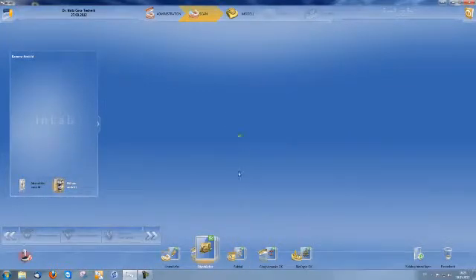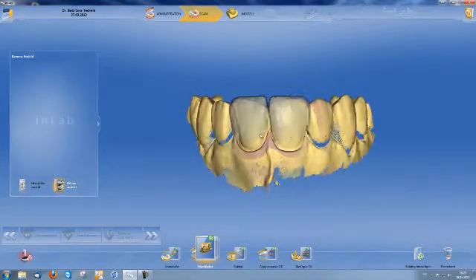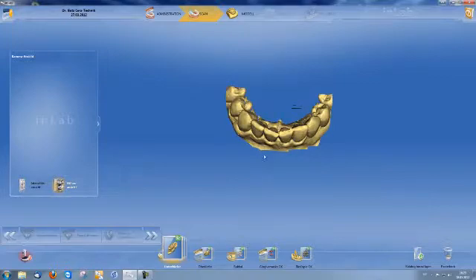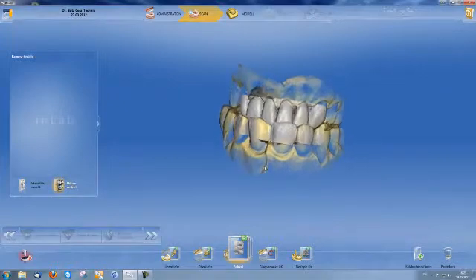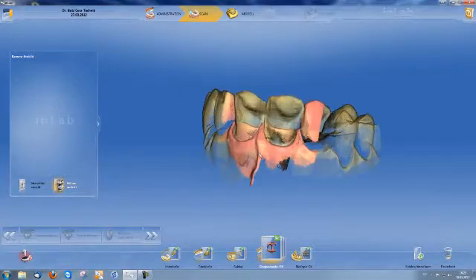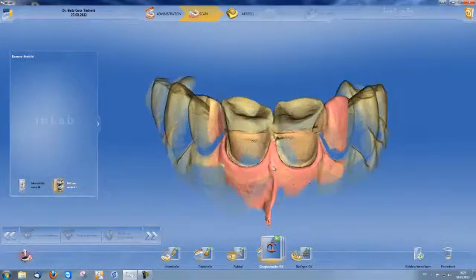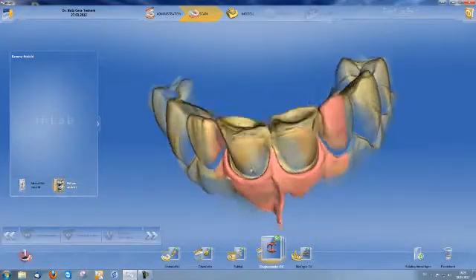I have scanned the preparation in the upper jaw, and you can see here the two anterior tooth veneers, lower jaw antagonists, buccal scan for registration of the restorations. Add to catalog. I have scanned my wax-up in the biocopy upper jaw and also added a fifth scan with the upper jaw gingival mask by scanning my gingival mask prior to sawing of the model. This allows me to design my emergence profile properly at a later date.